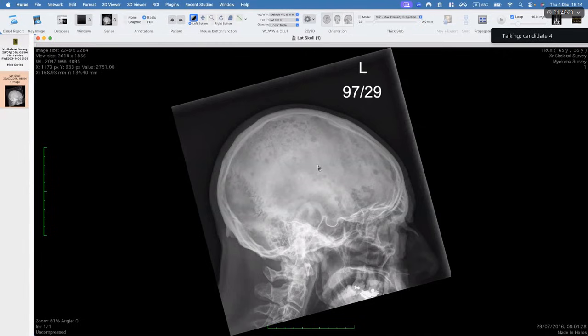Can I please know the age of the patient? 55 years old. So, the posterior occipital area has also got some focal area of lucency in a rather well-defined fashion. Ignore that. The only finding that I can see is these multiple variable-sized lytic lesions diffusely spread across the calvarium without any associated soft tissue.